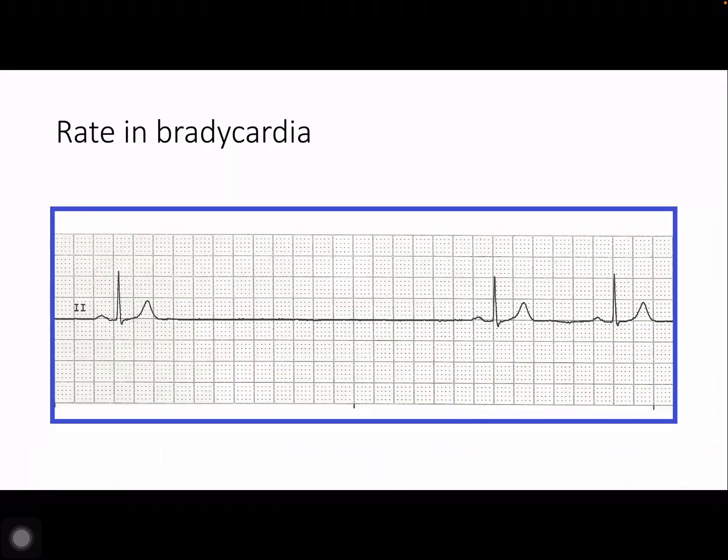If you look here, you can see these hatch marks here, here, and here. In between two of these hatch marks are 3 seconds. So in between 3 of them is 6 seconds. Consequently, you can count the number of cardiac cycles in that 6-second interval and multiply it times 10. Now, you don't need to be a cardiologist to tell that this heart rate is way too low. Here we would estimate this heart rate to be somewhere along the lines of 30.